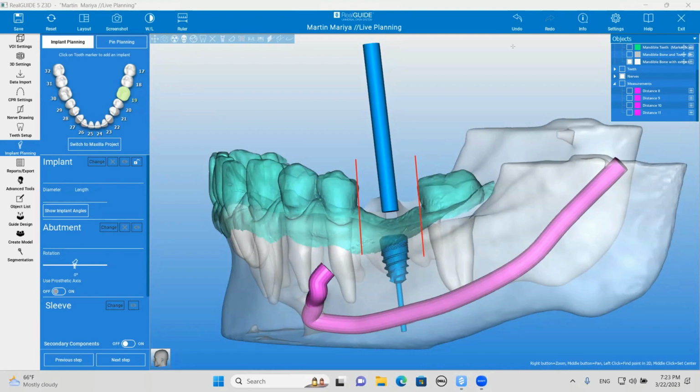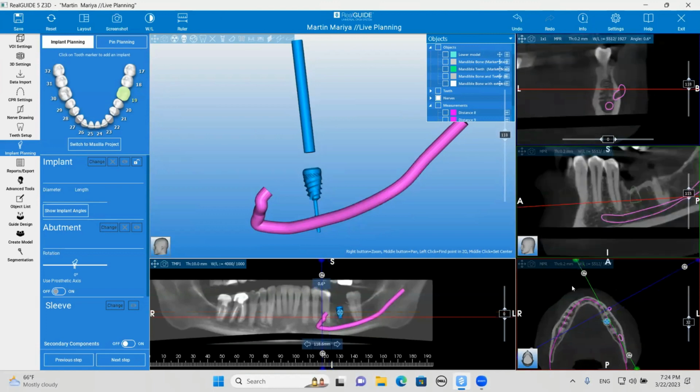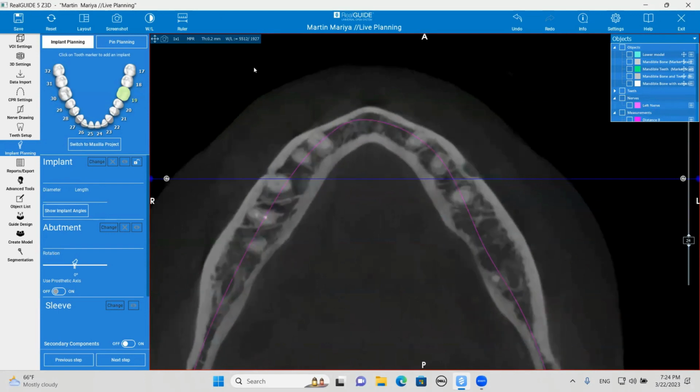The last thing I want to show you on this case, Scott, is let's say you were doing a bicuspid, and this nerve is pretty low, so it is a type 3 nerve. One variant of the anatomy of this nerve is what is called, okay, he's already 2 steps ahead of me. This is called the axial image, and what he's going to do is look for what we call the anterior loop. Hussein, show our audience what you're doing there.